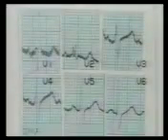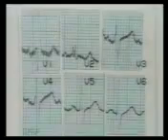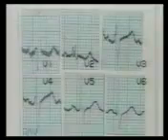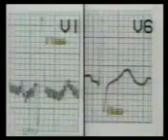In this ECG, V1 shows a tall R wave, taller than the S wave. So immediately think of right ventricular hypertrophy. There is a corresponding deep S wave in V6. So the normal QRS pattern in the chest leads has altered.